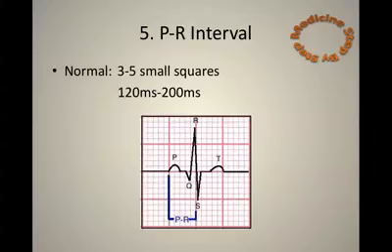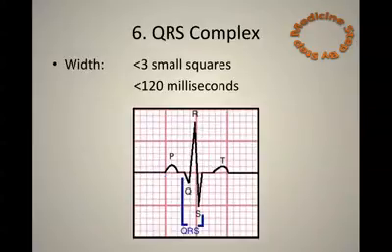And so, a widened PR interval represents a delay in conduction between the atria and ventricles. A short PR interval might, on the other hand, mean that there is conduction by an alternative pathway to the atrioventricular node, an aberrant pathway. Then I look at the QRS complex, which should be less than 3 small squares in width. A widened, broad QRS complex is pathological.